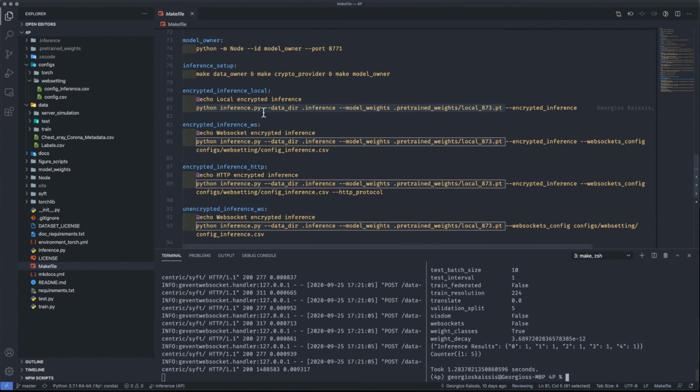And if you go and do encrypted inference, it'll take about 3 minutes for virtual workers, and it'll scale up, obviously, with the utilization of the network, and it'll depend, of course, also on ping latency and on the network speed you have and everything. In every case, it's still very efficient.